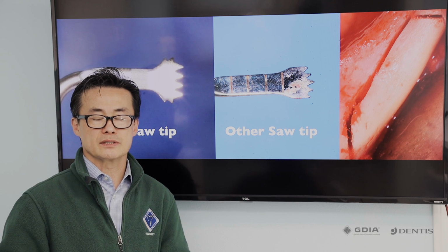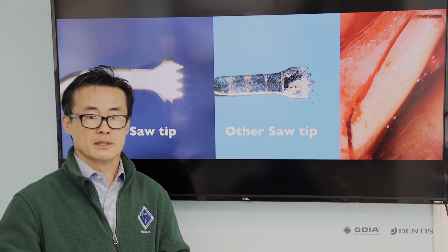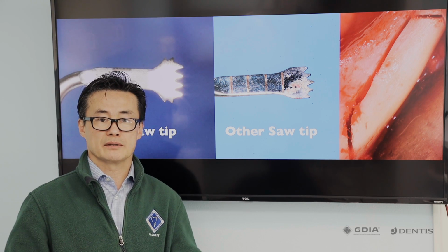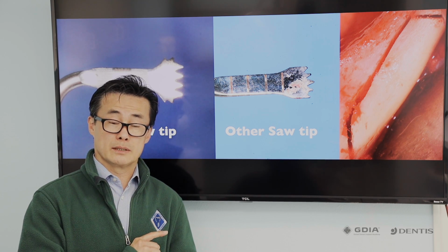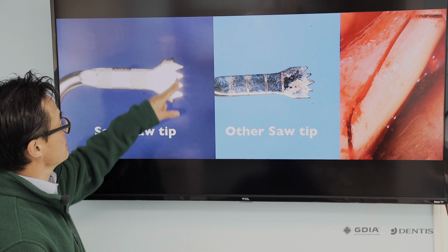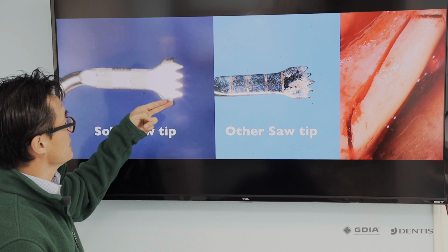And here is the tip that we like, my favorite. We use it in this program because of many good reasons. Because Dr. Son, who invented this tip design, used to be our co-director of this program. So Son tip, take a look on the screen here. It has a cutting blade not only in the most advanced surface, but in front and back.